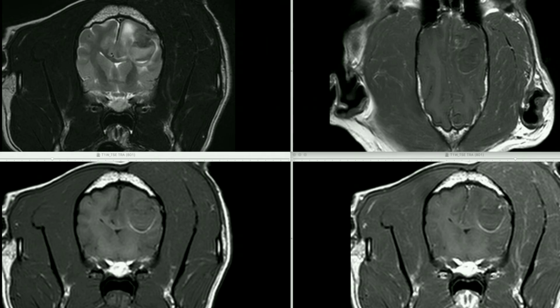The appearance of hemorrhagic brain diseases can be quite complex on MRI. The appearance of hemorrhage will depend on a large number of intrinsic and extrinsic factors. It will depend on the age of the hemorrhage, the location, the pulse sequence and the magnet strength, and also the underlying etiology. The key clinical question we're usually trying to answer is: is this malignant hemorrhage, so is it underlying neoplasia, or is there spontaneous hemorrhage due to such things as hypertension or coagulopathy?